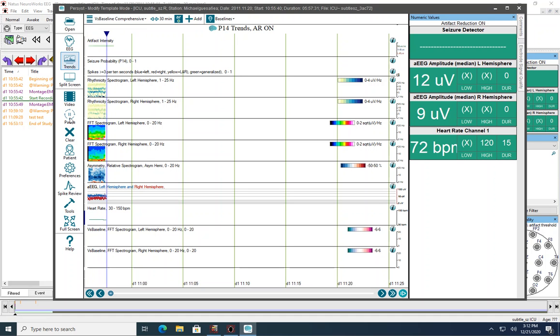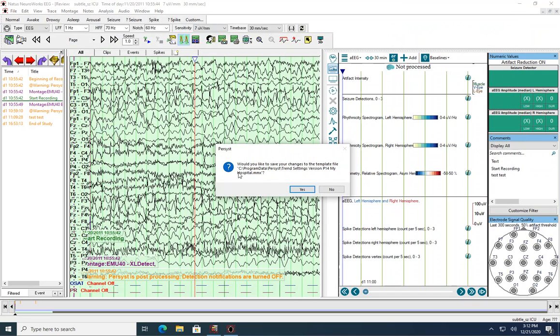And there's the heart rate, calculating along with everything else. And again, if one of those inputs goes bad, I still have the other one being charted. So that looks good. So I'm going to go ahead and pause here. And I'm going to close this window and go back. So let's close this. And I don't need to make changes, but that is the last one I did, the myhospital.mmx. So I'm going to save that.